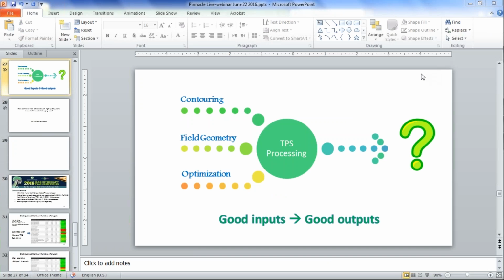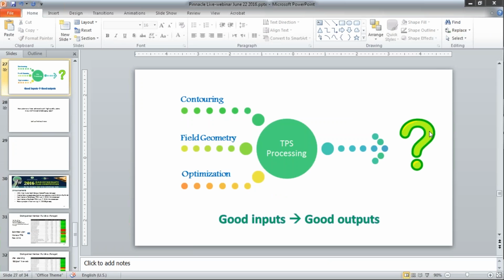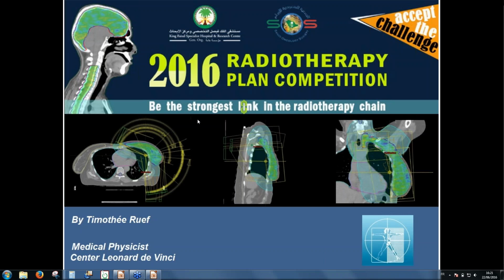Now I will start with Timothy. He will be explaining and describing his techniques in our plan competition. Hi all. I will show you now how I could achieve this high quality plan. So let's begin.